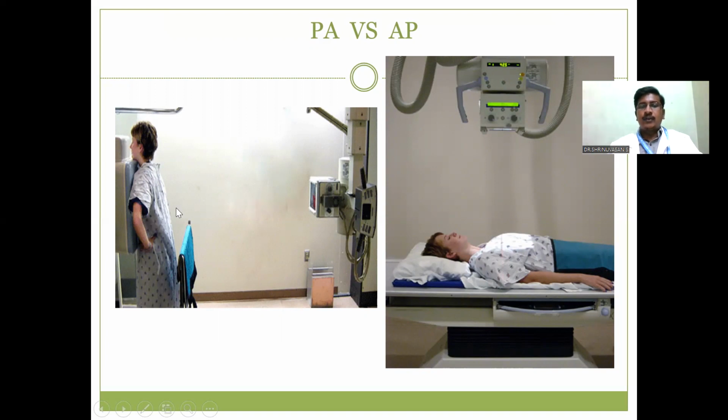For whatever pathologies we want to identify in a diseased person, we can use this PA view. For PA view positioning, the patients stand erect, abduct the arms towards the film, and lift the chin above. This view is called posteroanterior view, which is commonly used for pre-anesthetic opinion and normal routine medicine OPs. We follow this PA view only to find out the common pathologies.